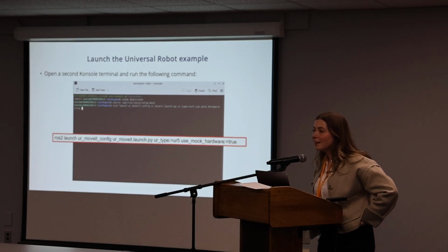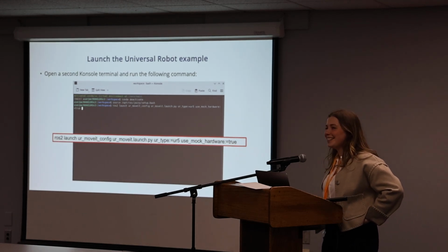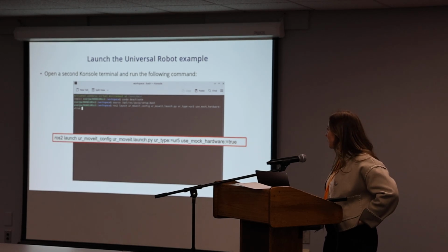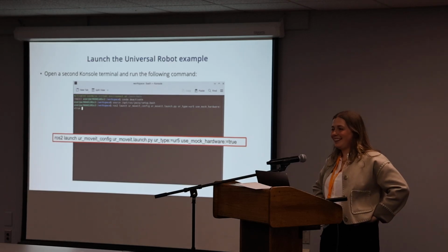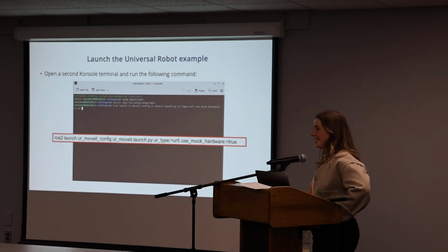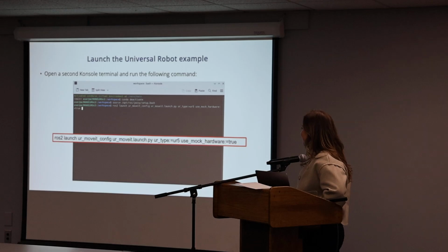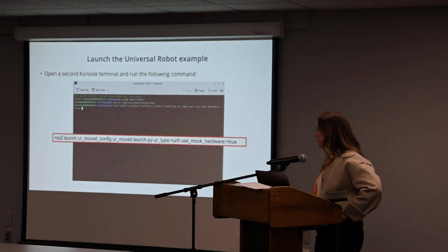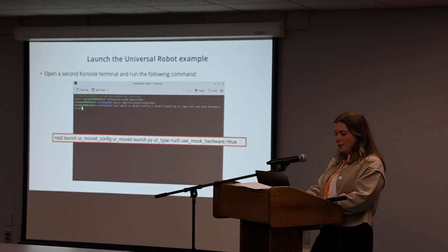Are we supposed to deactivate conda? No, that's a force of habit of mine, so it doesn't really matter. I find it sometimes adds weird behavior. You can do it or not. I've had it before where I was debugging something for like two hours and just deactivating conda fixed it. So it's like an involuntary thing. Okay, I'm going to port this over to mine as well.